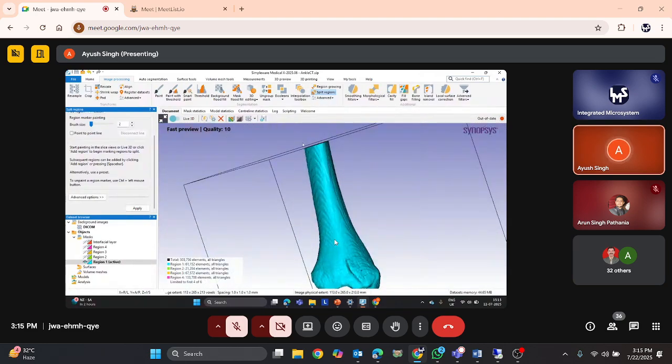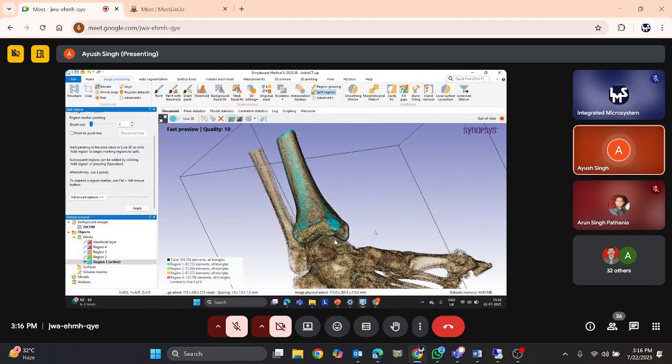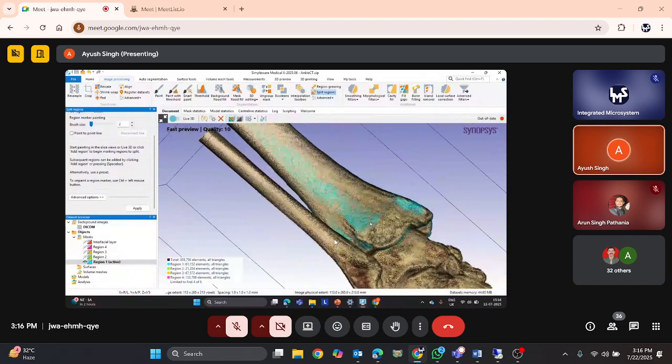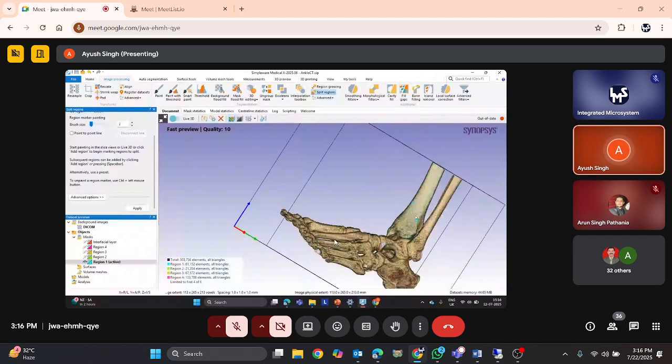One more option that we have is enabling background volume blending while we're working with data. Whenever we click this option, since this mask is already open, we can check over here, we can navigate, and we can check for accuracy, whether all the particular regions are being marked properly or not.